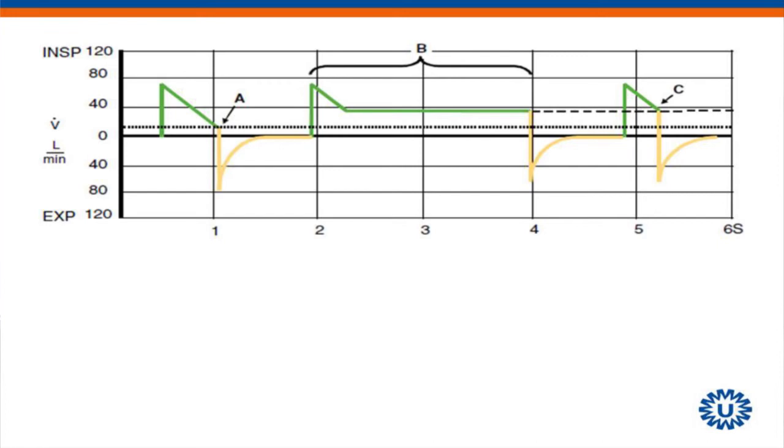Do we see it often? We see it a lot. But you only see it if you're looking at it. If you're not looking at your waveforms, you will never see it. But in this case, there is a strangely long inspiratory time for pressure support ventilation. I will show you an example of a real infant in a few minutes.